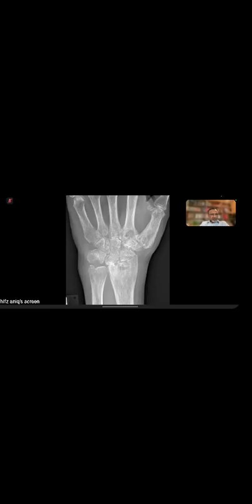Yeah. One thing I think you all mentioned, but you did not mention one thing, which is that this is actually gout. You know what we call the other name of gout? No, it's called the master masquerader. It is so difficult to differentiate from other conditions that it can mimic some other condition.